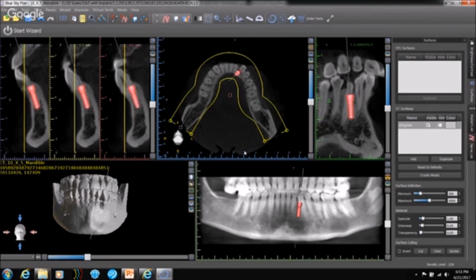This is critical also when it comes to designing guides. You do not want to be making measurements from a reconstructed panoramic view and then trying to correlate that to the guide or where you want your guide holes to be. As you work through it, you will get an idea how that correlates in terms of implant placement. You could end up making a measurement slightly over here, and your implant might be going in a completely different location, slightly anterior and slightly buccal, and those measurements don't correlate. But those are probably the only things that I've so far heard.